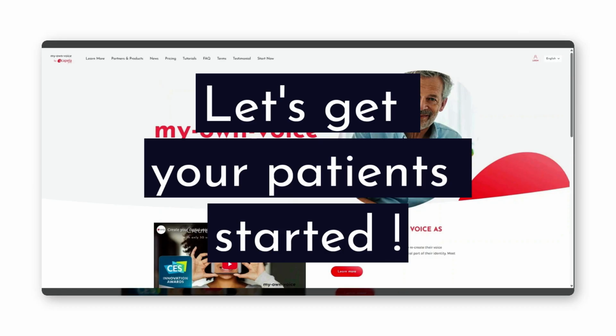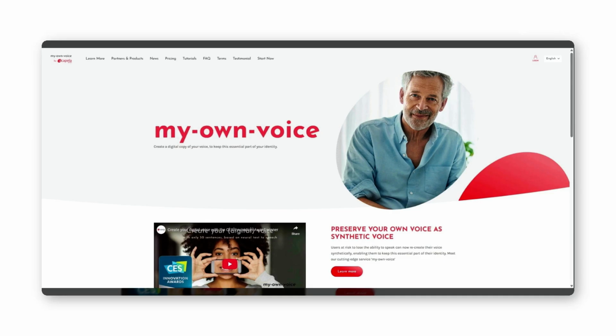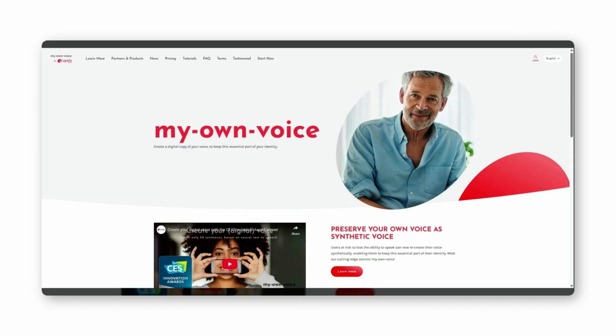All right, let's get your patient started. Each person must have their own account to record and create their personalized voice. No sharing accounts here. Each voice is unique, just like each person.